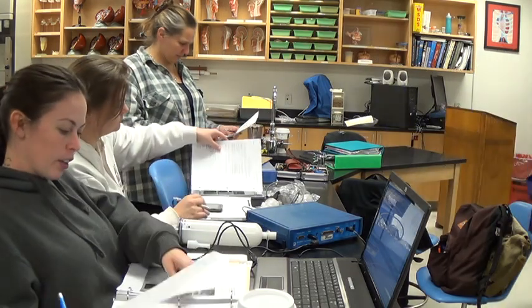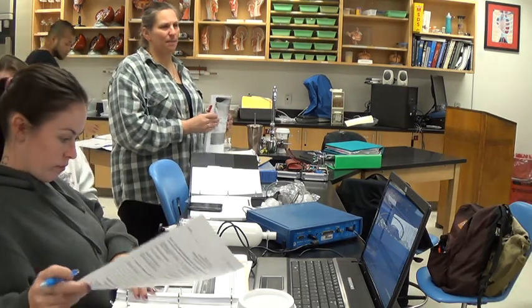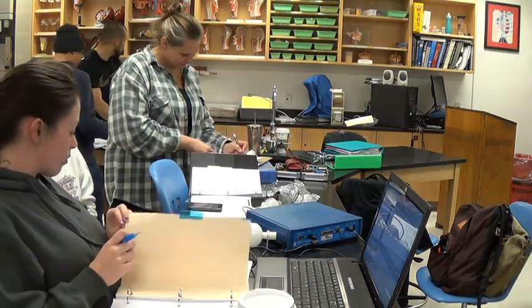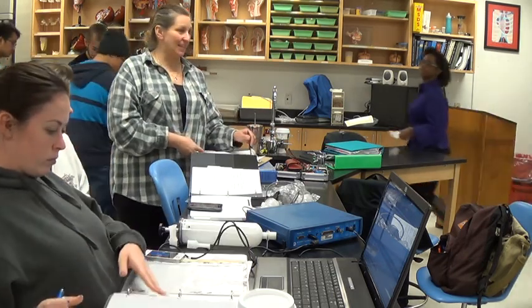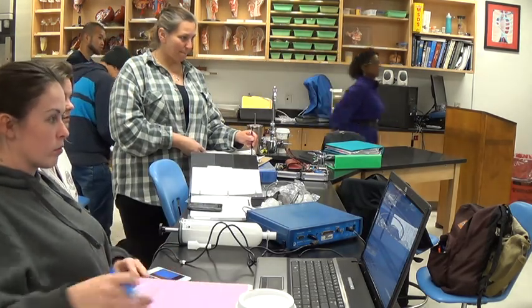165.1 tidal volume. It's not negative 400. Okay, Professor, we have a question. Instead of using the tidal volume that I did get, we used 500, and we still have a negative number. Okay, do you still have the data up there?